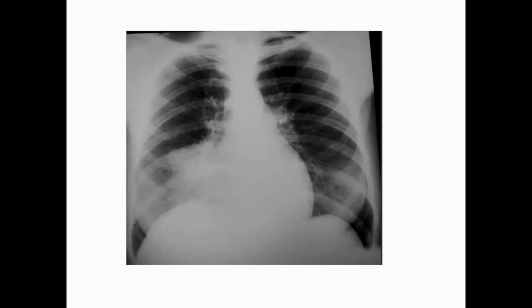But despite this, the clinical features matter. If this X-ray has been taken because the patient has fever and cough and is clinically unwell, then the clinical question has been answered, and you don't have to ask for a repeat chest X-ray due to the poor penetration. Despite the very poor penetration, you can still see there is an opacity or consolidation here. How are you going to interpret this?